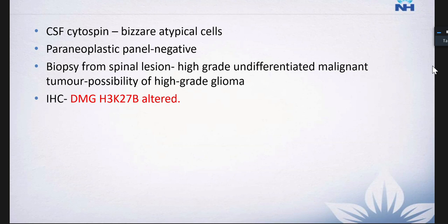But the clue is that when you see that despite your treatment there is no improvement on the scan as well as clinically, and the lesions look more nodular or mass-like, and you see disproportionate enlargement of the cerebral sulcal spaces, which indicates infiltration of cells, that could be a red flag that we might be dealing with some sort of neoplastic disease, and if needed, a biopsy has to be done to look for the correct answer, right?